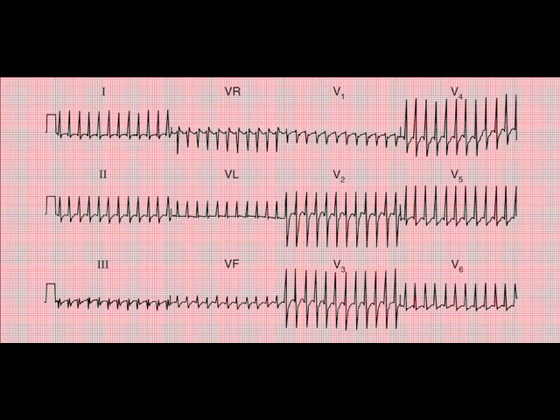And sometimes it's called a supra, meaning above, a supraventricular tachycardia, an SVT. I don't generally like that term because it's implying with certainty that the impulse is in the atria, and you can't be absolutely certain. This impulse could be driving the heart from high up in the ventricle and giving a very narrow QRS. It is possible.